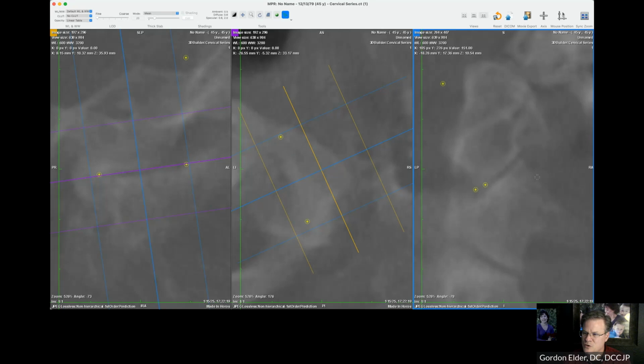Okay, so now I'm looking at the whole joint, and this would be how Dr. Blair's looking at it. Of course, he's looking through the jaw and everything else, but it looks like an underlap. So I'm pretty sure it's a PIL, but like I said, we can actually make it clearer. The problem is the thinner the slice, the more careful you have to be that you're in the right place.